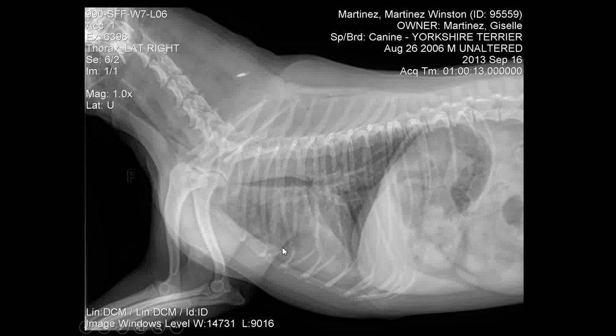Here's a lateral film, an excellent looking lateral film. Here's a vertebra. This is a chip. Okay, this is an identification chip. Animals are microchipped to try to find their owners. It's usually placed subcutaneously between the shoulder blades. Sometimes this chip can migrate. You can find it around here, sometimes on the animals, but that's what that is.